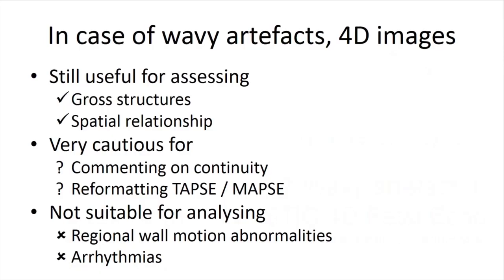But in case of wavy artifact, is it still useful? Yes. It's useful for gross structure assessment and for understanding the spatial relationship between different parts of the heart. But you have to be very cautious in commenting on the continuity of different chambers. You also have to be very careful about using this technique for reformatting TAPSE and MAPSE measurements.